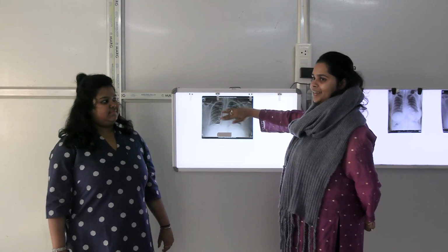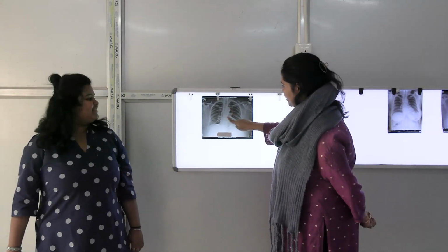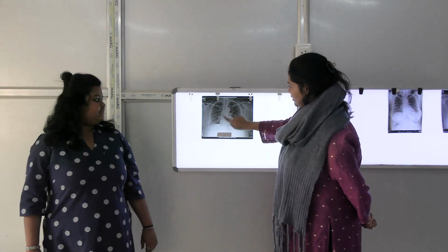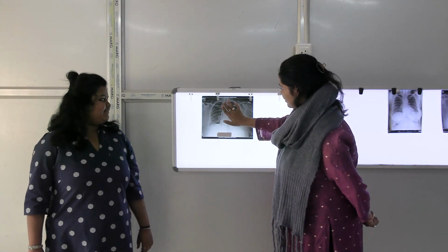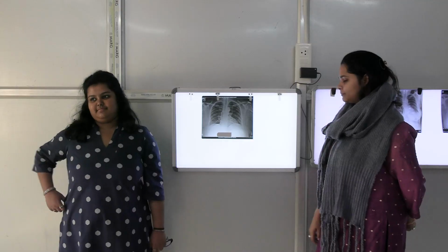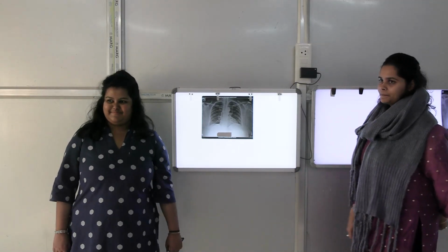Behind the two lungs? Between the two lungs. Okay, between the two lungs. Then show me the space between the two lungs. This space. So what are the lateral borders of it? Trace it above down. Simple thing. So you have to identify the space: right, left, above, below. That's the space, the mediastinal space. Okay, that's it. Good.